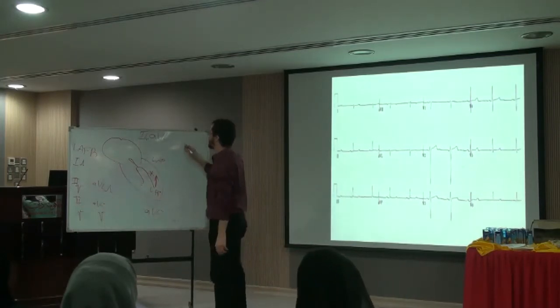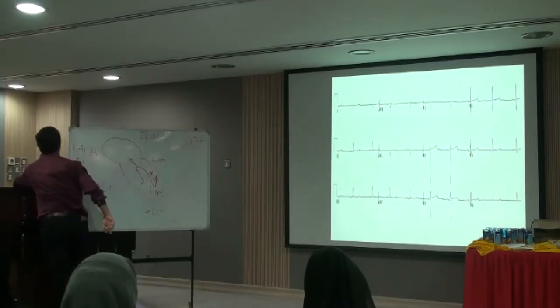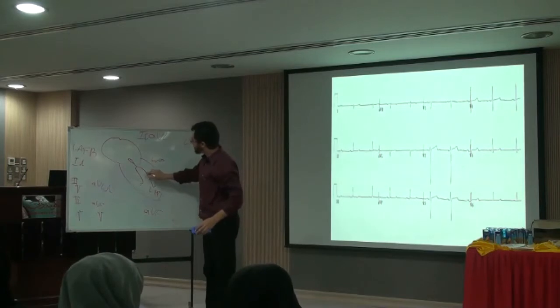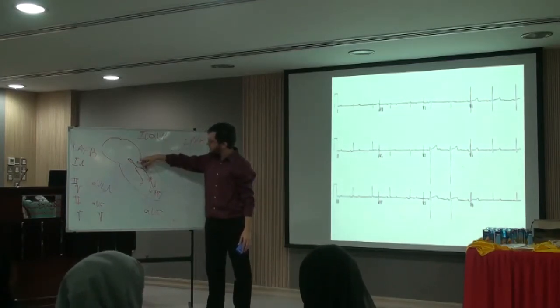Okay, so can you guess the left posterior fascicular block? The block is here. What will happen? Electrical activity will come this side and activate this part.